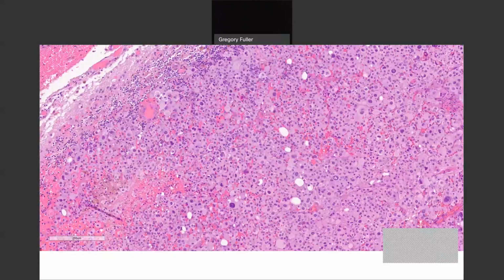All right, I'm asking, okay, good job, Dr. Gilbert, pretty good. I want to be a little bit more precise. So look closer, Dr. Gilbert. There are at least 3 or 4 major findings. The neoplasm is the most obvious, and yada, yada. It's the other things after you've gotten past this epithelioid neoplasm. That's just the baby starting point, right? Now, this is to emphasize detail. And there's actually even more for that.